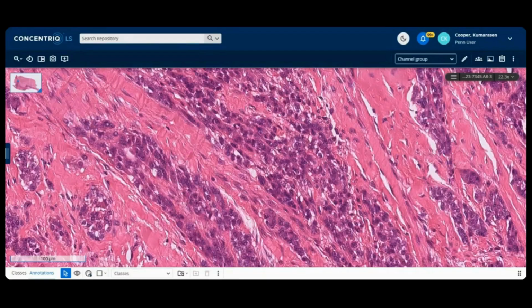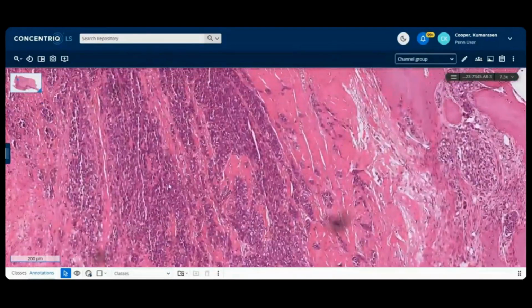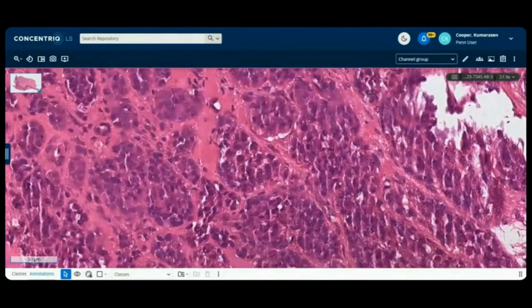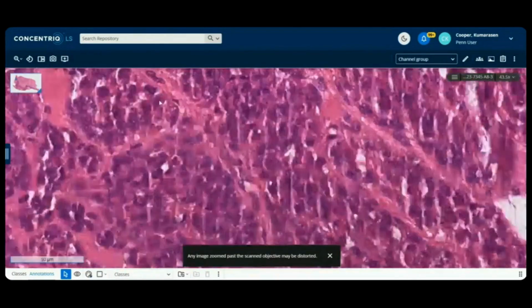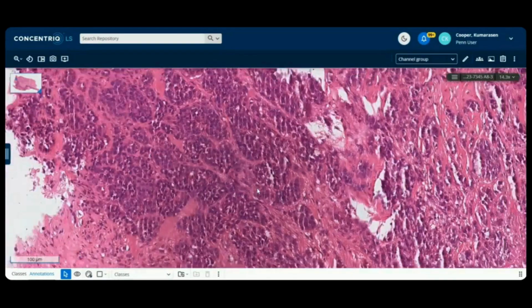Multinucleated giant cells, like mentioned here, this sort of wreath-like giant cells is a useful clue and can be helpful, not to be confused with the osteoclast-like giant cells or the Touton-type giant cells. I did not see any, and I'm just looking here now because I don't remember whether there were any giant cells. But the nests and cords are useful, very nested. And remember, these can sometimes be even spindled. You can get spindle cells as well. And immunos and your FISH analysis will help bail you out.